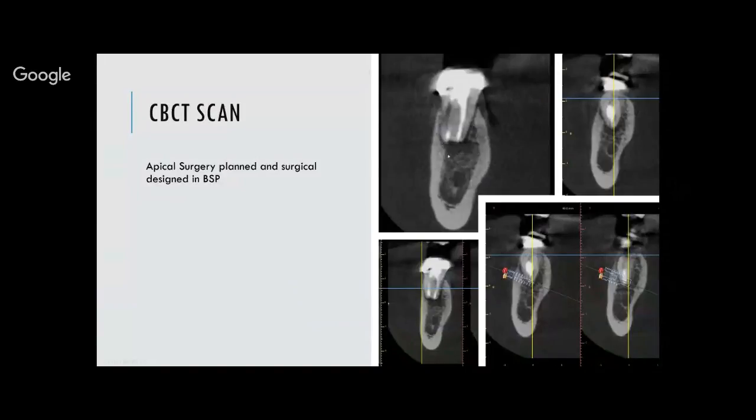This is the lesion on the front root. This is the inferior alveolar nerve canal. And the way you plan it, I have to plan like an implant placed at the apex. To the apex, you can't go straight sideways like this and make it flat, because your mucobuccal fold is somewhere up here, and also it will be very difficult to get your drills flat and straight into the guide like this. So you have to have as low of a tilt to the implant as possible.